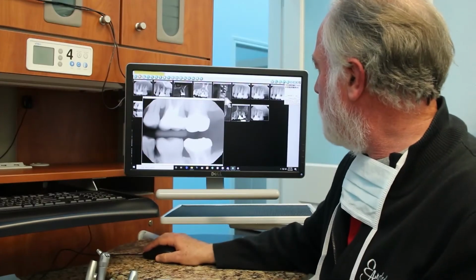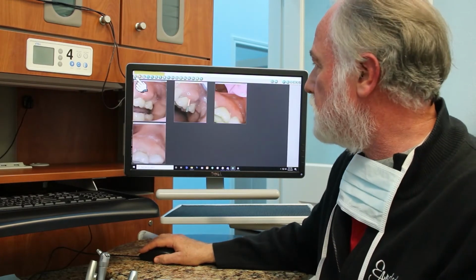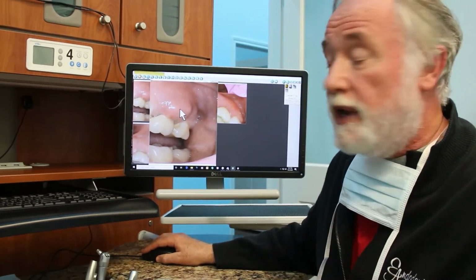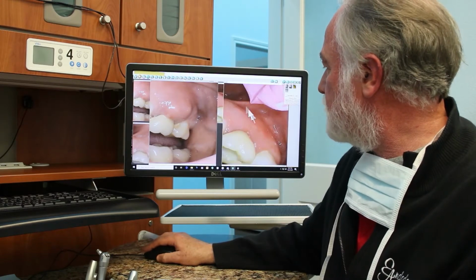Okay, now we move ahead. Let's go back and take a look at the picture. So we redid the root canals, and remember this big old nice little infection here that was going on. So come back in 3 weeks, and what do we see? Let's pin that on the board so you can compare them side by side.